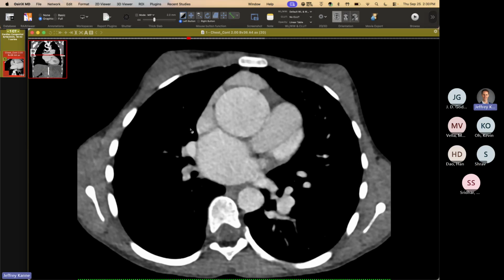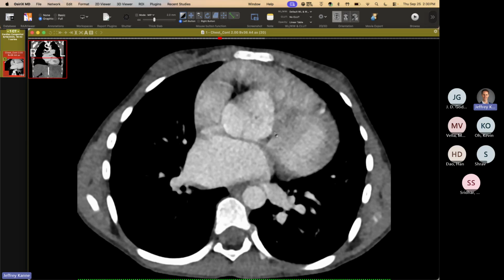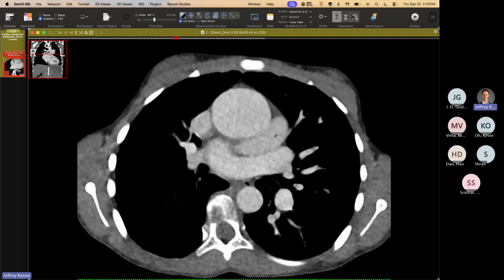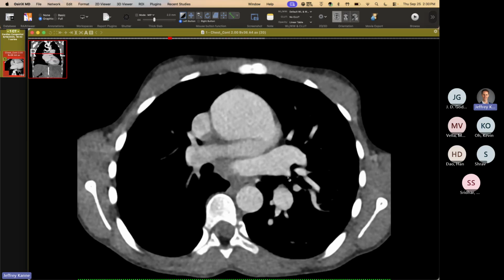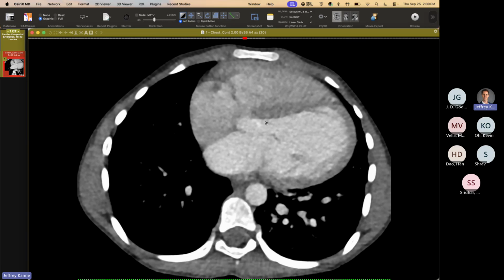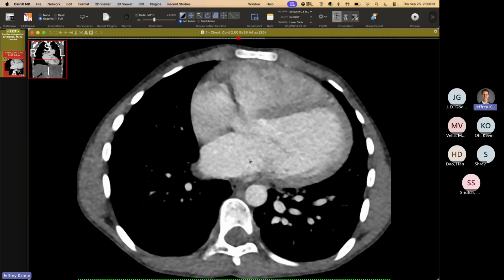And I guess, because there's no real outflow tract obstruction, there's probably less cyanosis. There's less shunting. But I mean, the left lung's getting systemic supply, and the right lung is getting the supply. But of course, with the VSD, it's all an admixture lesion anyway. And you can see there's really not dilation of the right heart chambers either. So no RV failure at this point. So very fixable, I would presume. He's not been taken to surgery yet. Don't know. I don't think so.